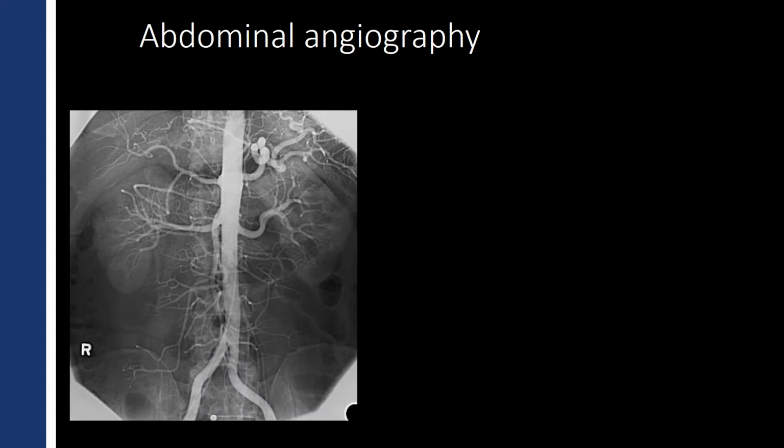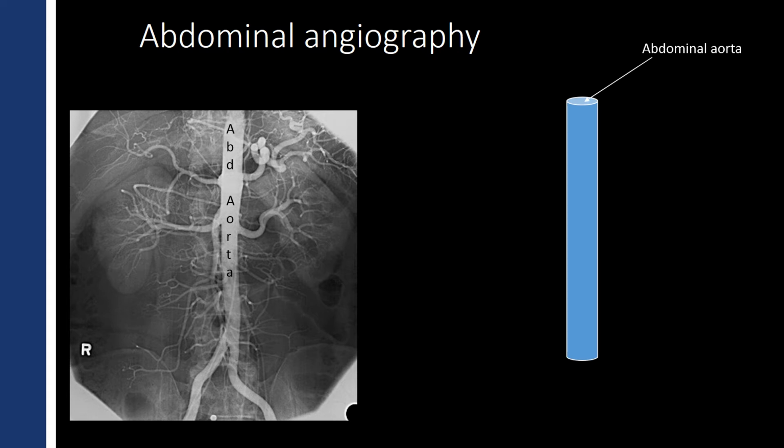All right, here is the dreaded blood supply of the abdomen. Of course, the main artery that supplies the entire abdomen and the pelvis is the abdominal aorta, again running just to the left of midline, down the posterior abdomen. The first major branch off the abdominal aorta is the celiac trunk. Now, we don't see the celiac trunk on this angiogram because it's coming straight out at us. And so the celiac artery is lost within the opacification of the aorta. But the celiac then branches off to the left into the splenic artery.